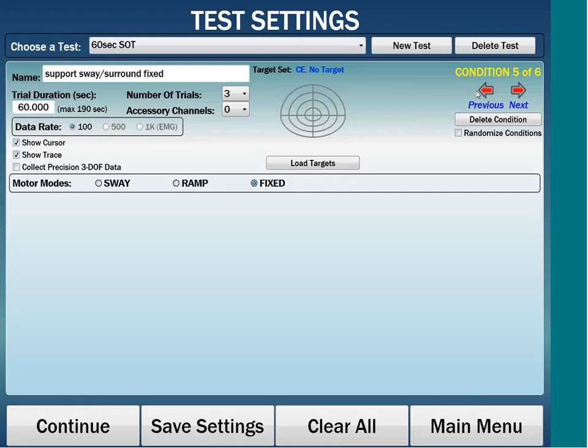The research module on a static system can be effectively compared to custom training, but with the added capability to save raw data for export and offline analysis. While the custom training allows a no time limit mode, it allows it because raw data is not provided. Since the research software does provide raw data, the trial duration is limited to 190 seconds.